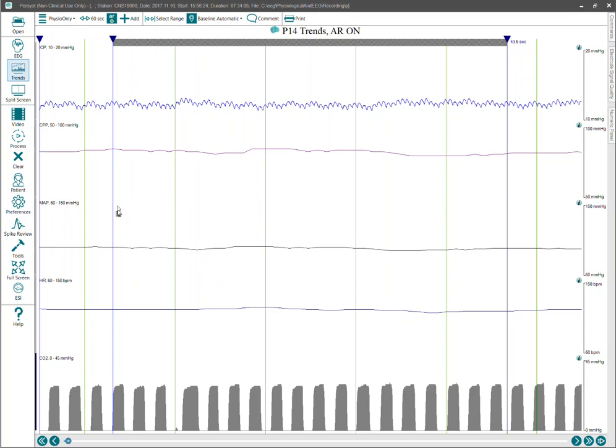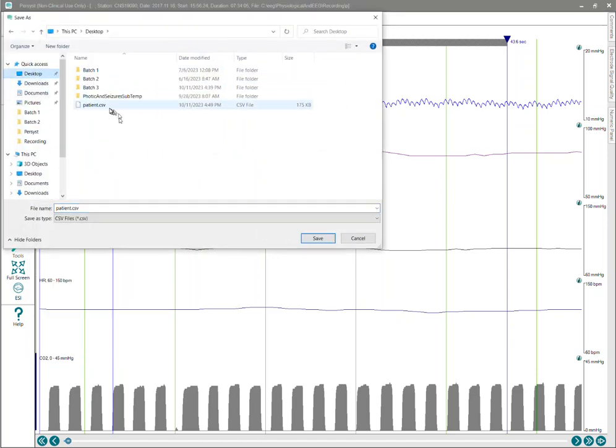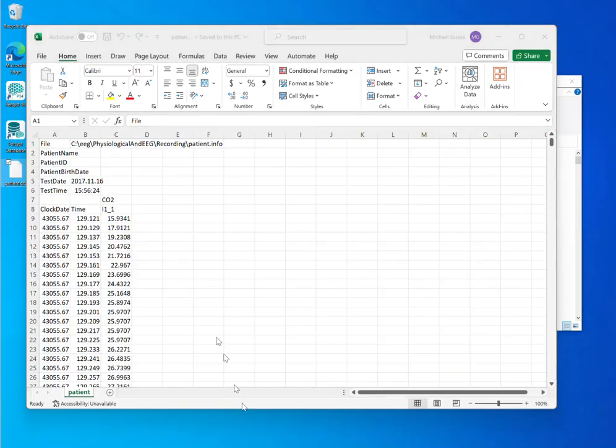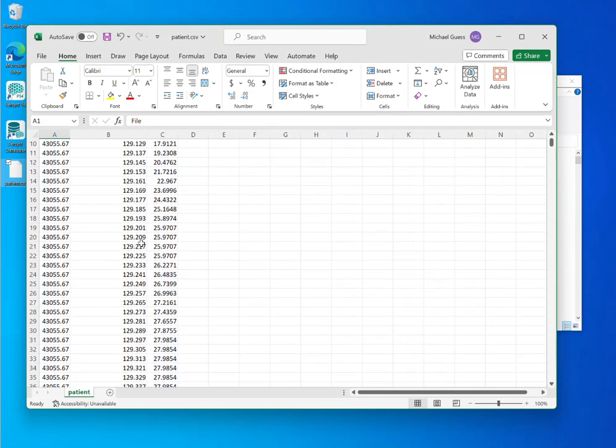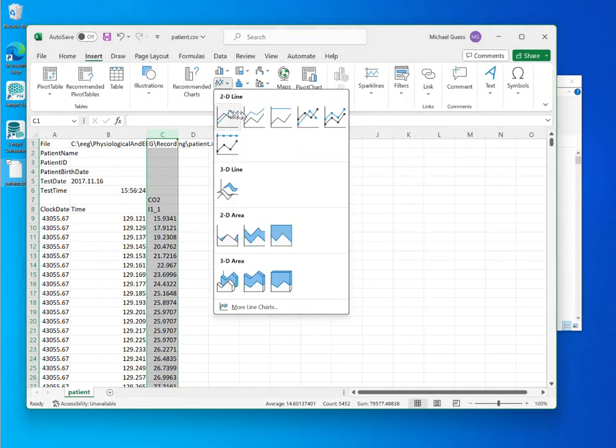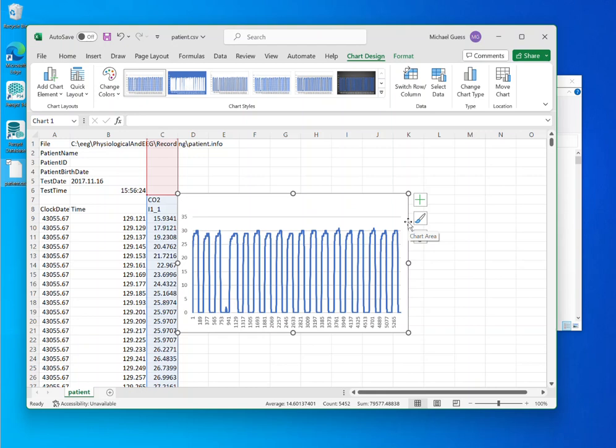All right, so we're going to do CO2, same thing. I've just highlighted the CO2. We'll go to Tools, Channel, Trend Values, drop this on the desktop, just overwrite that old one, and we'll get the same thing. And there are the CO2 values. We can make this time column a bit larger, but you can see here that it's a higher resolution. Highlight this, and we can draw that out. And there's the CO2 at its native resolution, at least in the trend. So that's how you get the higher resolution stuff out. And of course, it's all elapsed time, so it's time stamped.